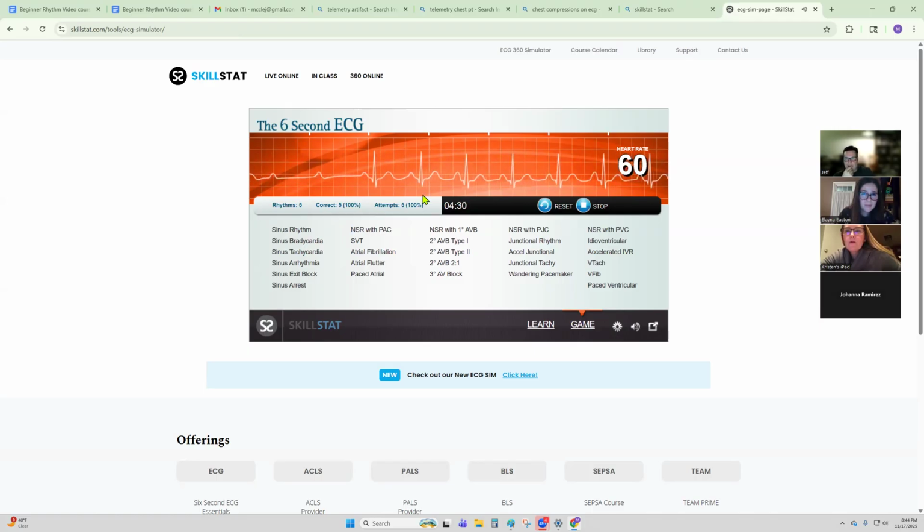A little bit. I mean, at this point, we would be nitpicking. I would say it does not change. Okay, because that gets me sometimes too. I'm like, there looks like a small one. P to P's marching out. Extra gap of time.